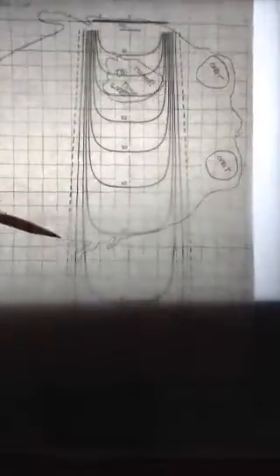For example, this area of the contour is relatively flat. So when I put the T-bar against it, it looks really parallel, so we could expect that the lines will not shift much. So for this exercise, I'm going to put the beam over here right through our tumor. I have a tumor here, and I'm going to put my beam approximately through the center of the tumor. So I'm going to make a dot there. You could extend that and create a central axis if you want to. My beam is going to come through the center of the tumor.